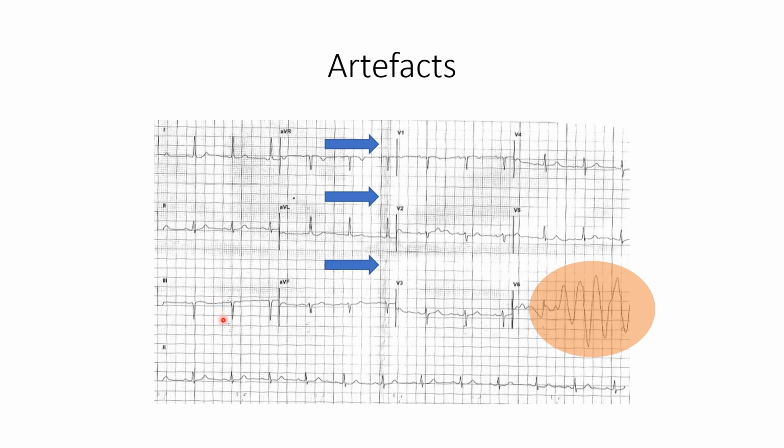Just to be clear, you can have things here that are strange VTs, and then around here it becomes normal. That's just because, well, this is time 0, this is time 1, this is time 2, this is time 3, right? So if you have at time 0 a strange pattern, then that's possible, and the rest will be normalized by time 1 or time 2, right?